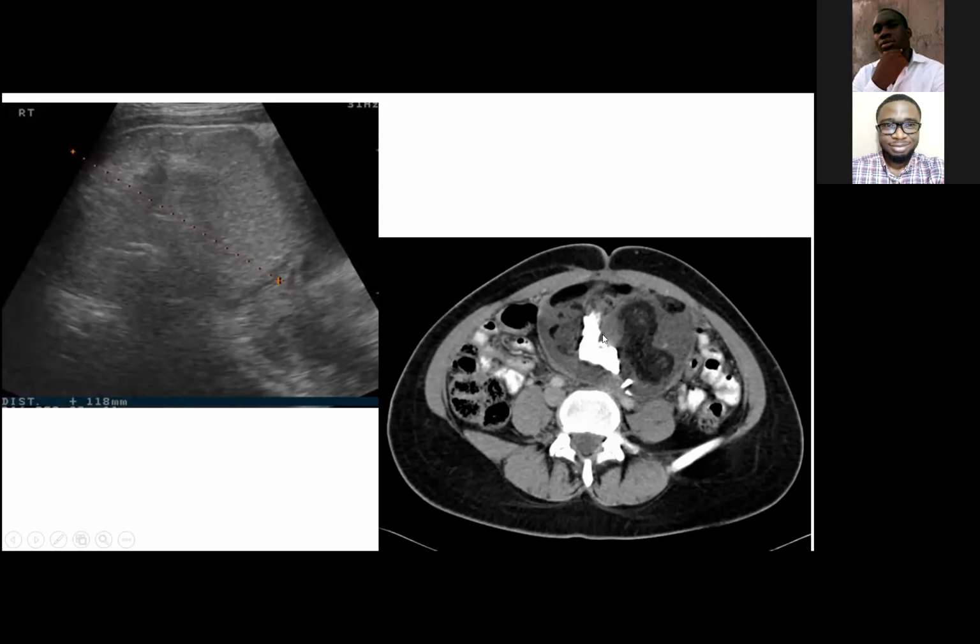Now you can see on the CT scan in the center of the image there, you've got these dense opacities, and surrounding that, you've got areas of low density soft tissue. My arrow is just hovering over this area here, and this looks just like your subcutaneous fat. So you've got a mass in the pelvis containing calcifications which look like teeth. You have fat in it. As I said, it looks like your subcutaneous fat. So you're right, this is clearly a mature cystic teratoma or a dermoid which had ruptured into the peritoneal cavity.